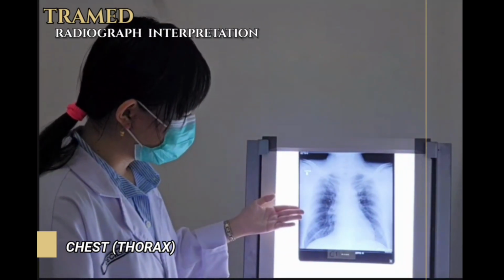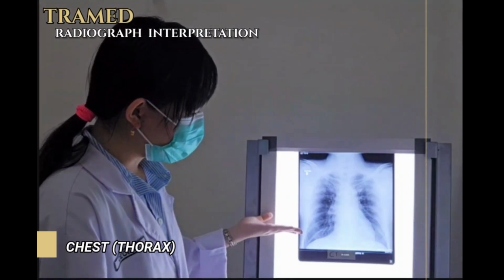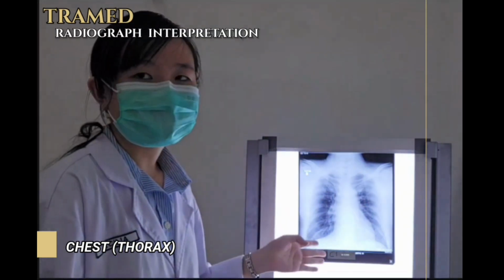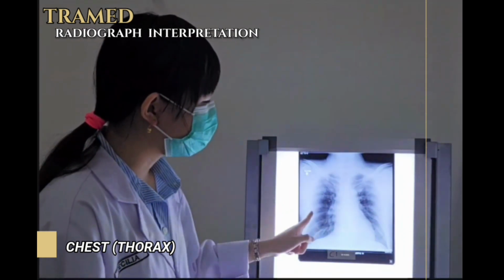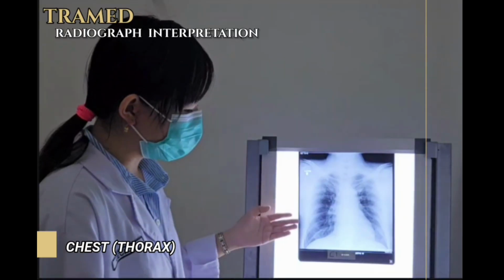And for the soft tissue, there are no foreign bodies and also no subcutaneous emphysema. We look at this, there is no emphysema. If there is emphysema, the color is more like dots in this part, but there is no emphysema, right? And next is about the bones.